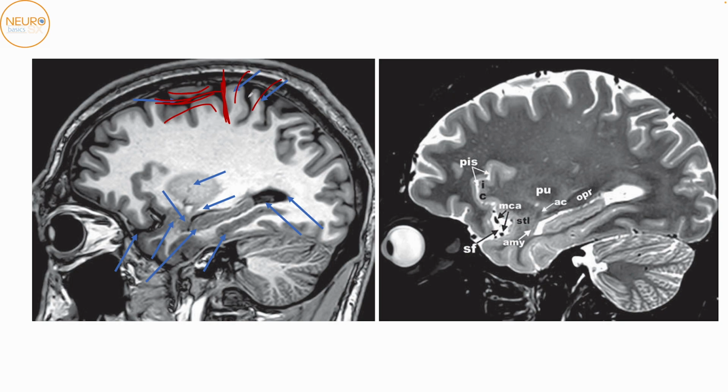So one more way to identify on sagittal imaging how you can make out the pre and the postcentral. So look for the superior frontal sulcus. Look for it ending in the precentral sulcus, and then identify the pre and the postcentral gyrus. Another way is obviously look at the thick and thin sign all over again.